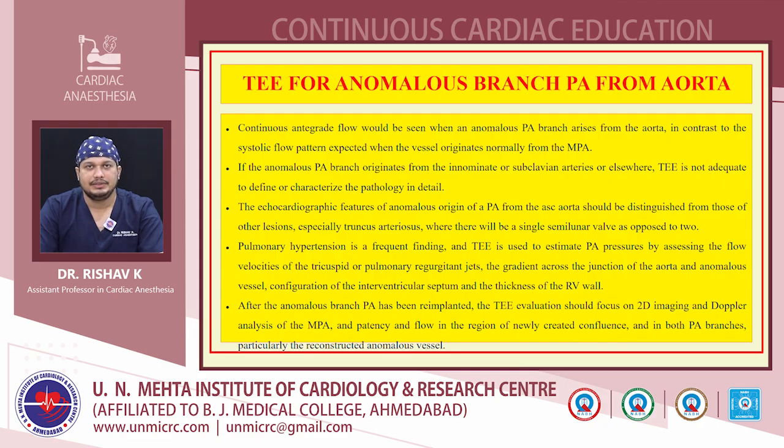The echocardiographic features of the anomalous origin of a PA from the ascending aorta should be distinguished from those of other lesions, especially truncus arteriosus, where there will be a single semilunar valve as opposed to two. This is also a very important point. We have to differentiate this lesion from truncus arteriosus. As I have already mentioned, in truncus arteriosus there will be a single semilunar valve which may have multiple cusps, up to 6 cusps may be present, whereas in this lesion there will be 2 distinct semilunar valves, both of which will be tricuspid in nature.